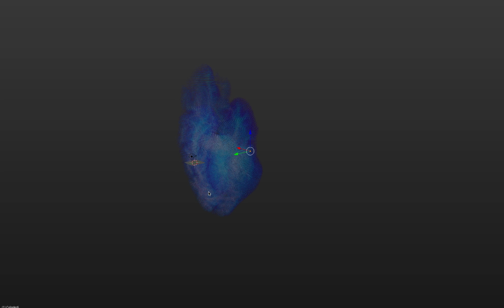And I'm just twirling it around here so you can see how the brain looks when it's rendered in this way. You can see the cerebellum here. And what's useful about this technique is that instead of rendering surfaces, it actually renders the whole brain.